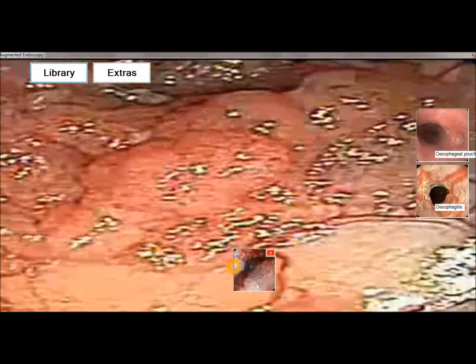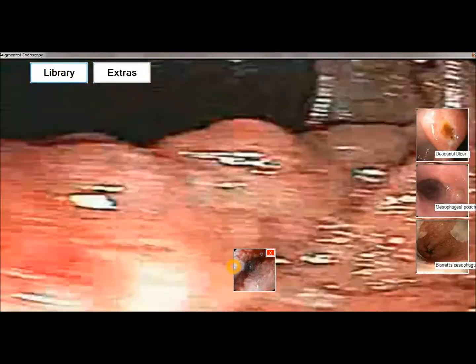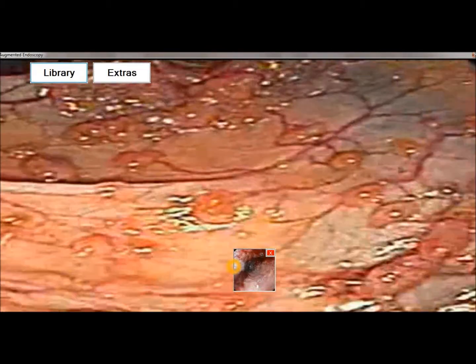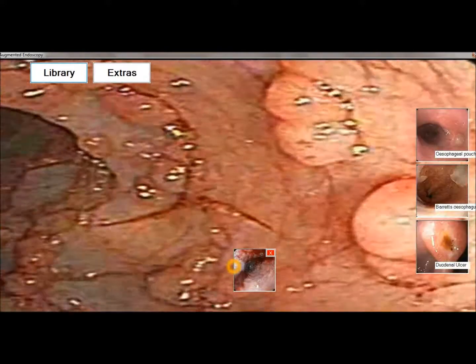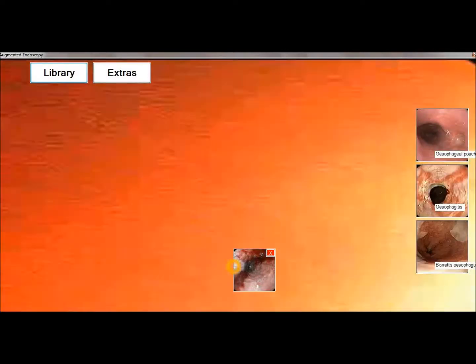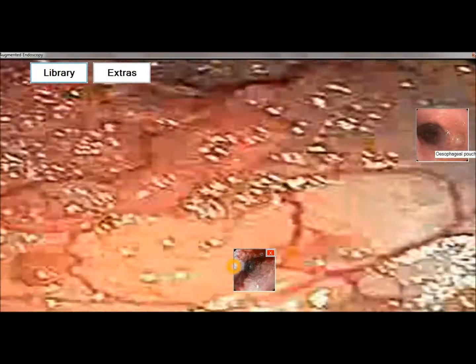The result is that the first method is able to detect polyps reasonably successfully. The second method is perhaps a little cautious, but able to find results. And the third method is perhaps a little overzealous, but also still reasonably accurate.